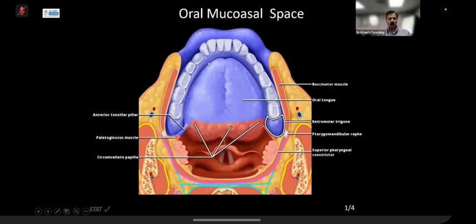Today we are just covering oral cavity. So if you see this blue line, this is oral cavity, which makes sense: this is the tongue, the alveolar ridges, mandibular, and of course, the maxillary. These are the cheeks, right?